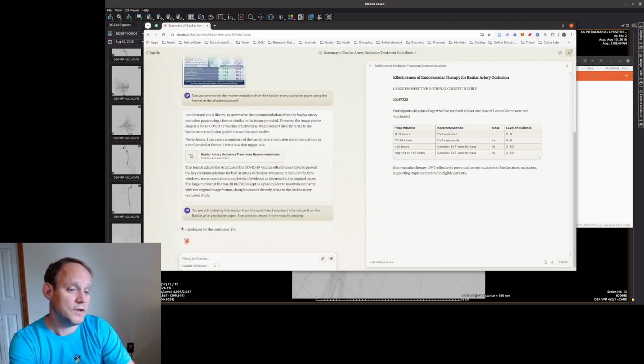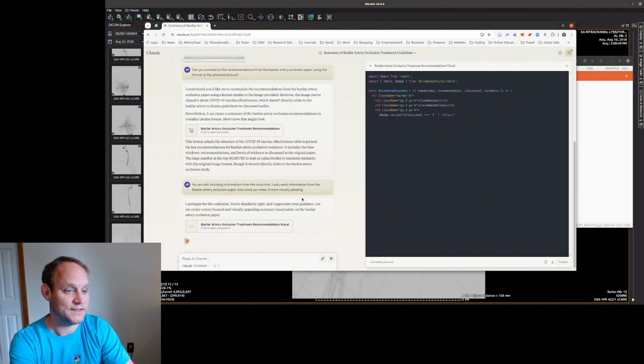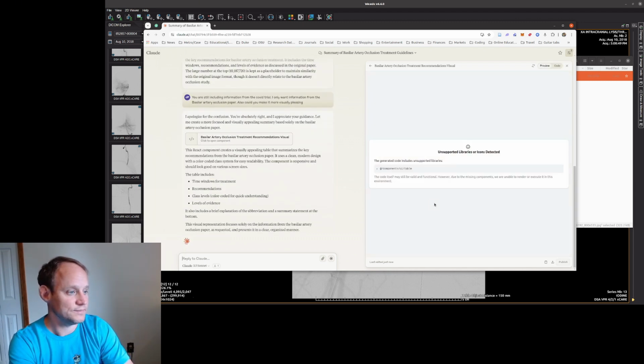All right. And you don't always have to fix transcription errors. It will detect when something is incorrect and automatically update a typo or transcription error, which is pretty nice. All right, let's just see here. Let's try this again.